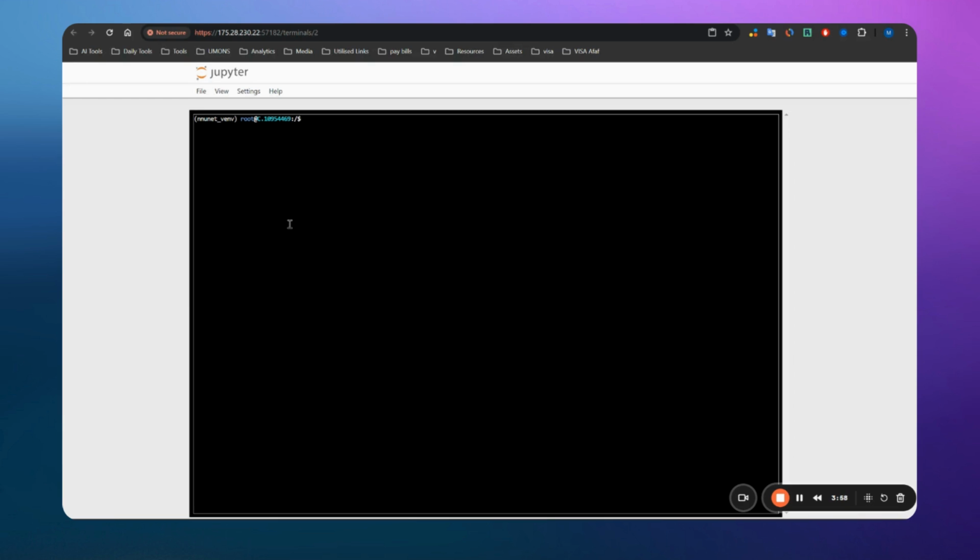What we can do now, we can start downloading the dataset. We can start doing the renaming, the pre-process, and all of that. So I will just keep it for another section of the course. So yeah, this is it for the server. And as I said, if you do have a server, you don't need to follow all these steps.